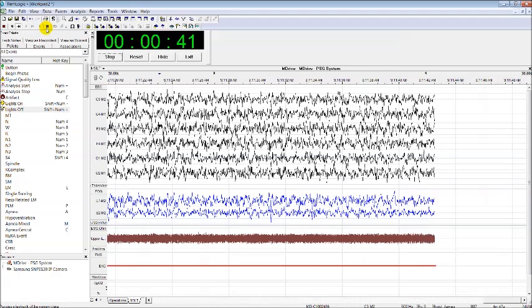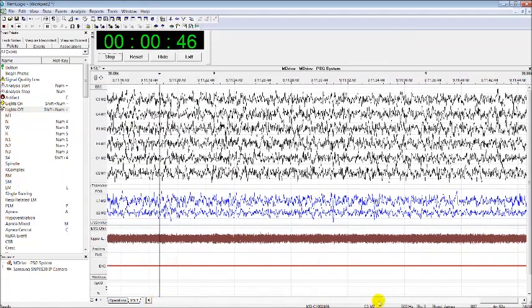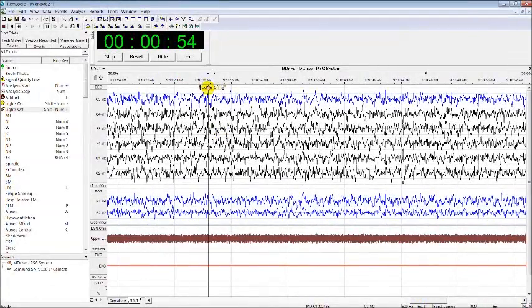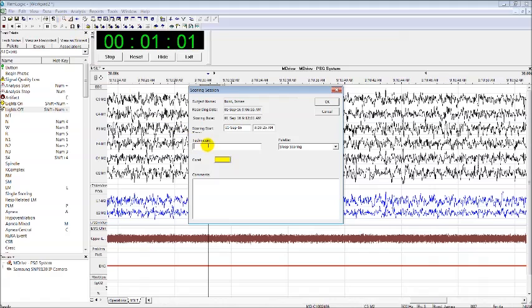First of all, I'll just pause it. I'll go back to the lights off that I set earlier. I'll click on here, and then go to events, new scoring. This is the part I want you to pay attention to. For each nap, it has to be a new scoring. For example, I put here John.